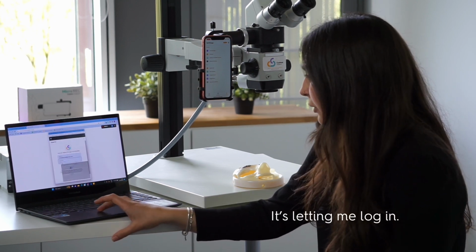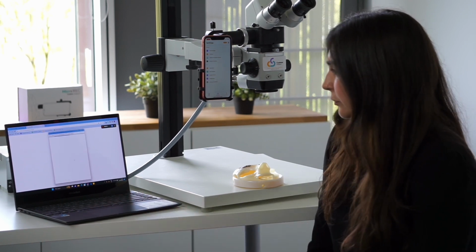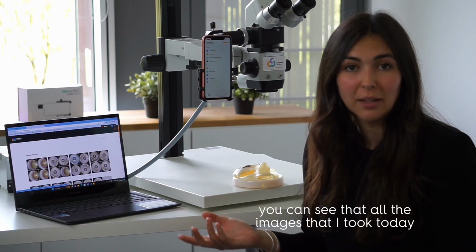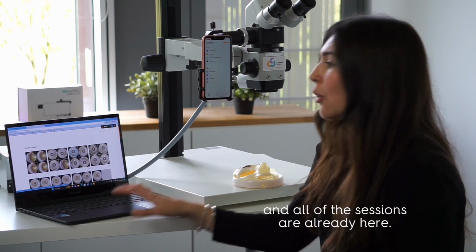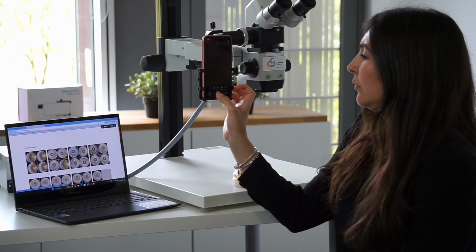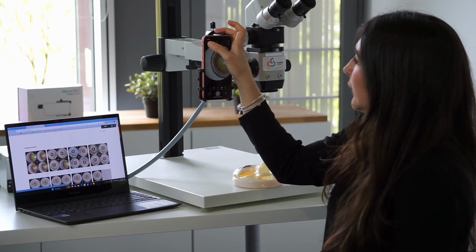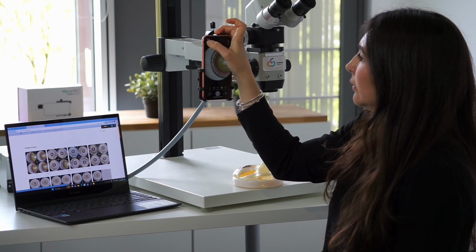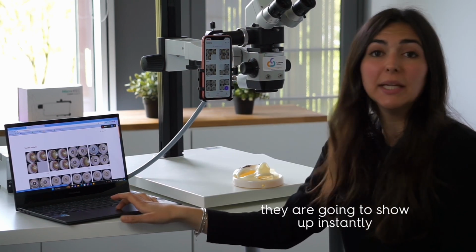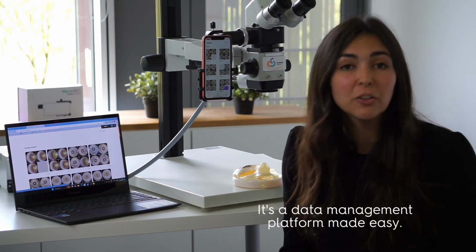It's letting me log in, continue. And basically here you can see that all of the images that I took today and all of the sessions are already here. So if I take new pictures now, and I go back, they are going to show up instantly on any device that you have. So it's a data management platform made easy.